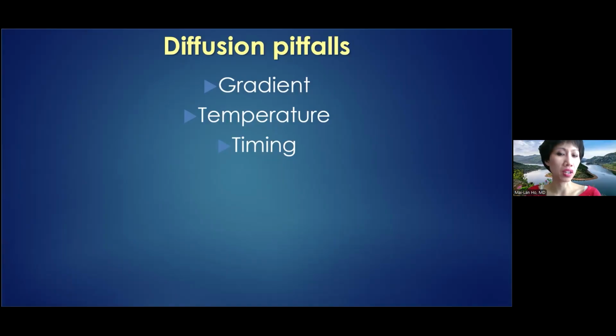And you can also do synthetic gradients. I recommend that, honestly, because if you already have two B values, 0 and let's say 800, you can essentially generate other synthetic ones if you want to exaggerate contrast without trying to overcall.